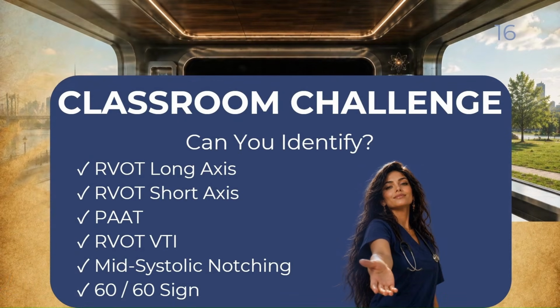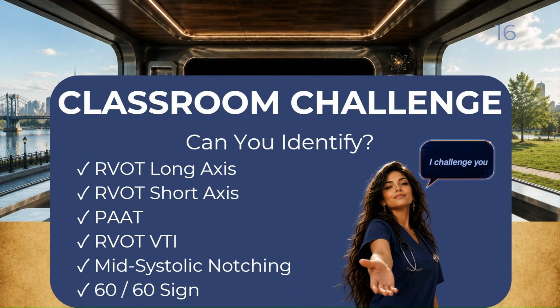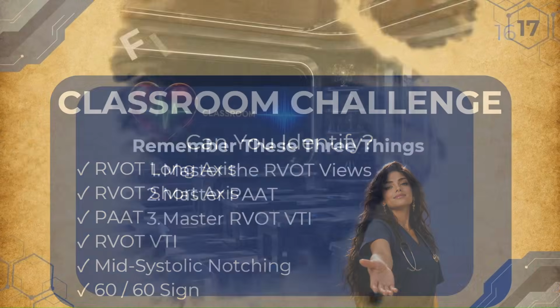Now here's a classroom challenge for you. Before moving on, challenge yourself to identify each of these findings without looking at your notes. If you can recognize these concepts consistently, you're well on your way to mastering the pulmonic valve examination and becoming an outstanding sonographer. Final takeaway.